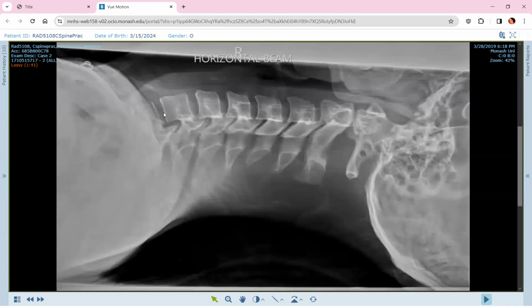On the lateral view, if we look for any evidence of malalignment, we can see that the anterior vertebral line, the posterior vertebral line, the spinal laminar line, all seem intact, and there's no fractures of the spinous processes, and the soft tissue seems fairly normal as well.